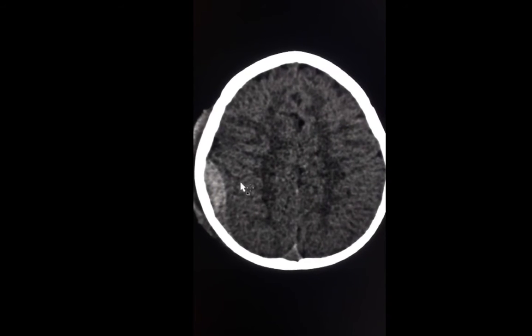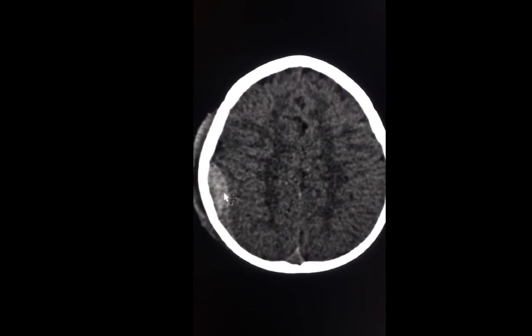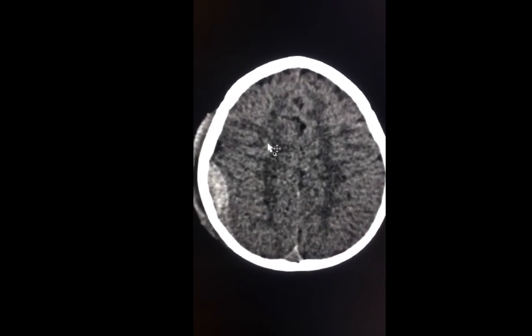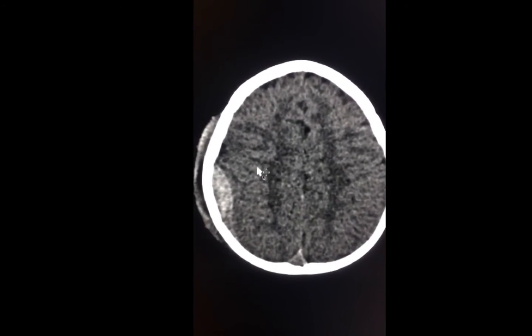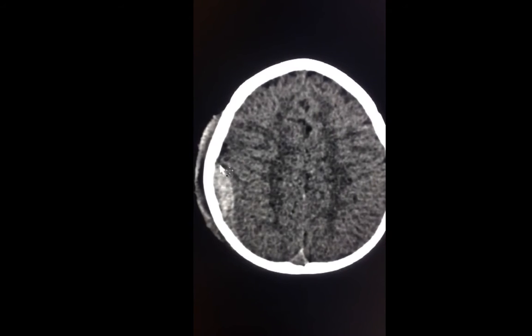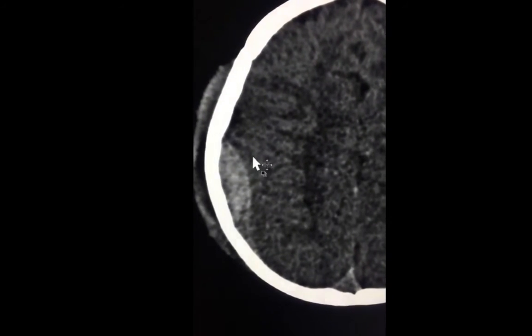Once you see a fracture, make sure an underlying hematoma is not present, and unfortunately there is a hematoma in this case. We learned from previous snaps that intracranial bleeds could be classified into intraaxial within the brain parenchyma versus extraaxial outside it. The way this hematoma displaces the brain inwards without associated surrounding edema is consistent with an extraaxial bleed.